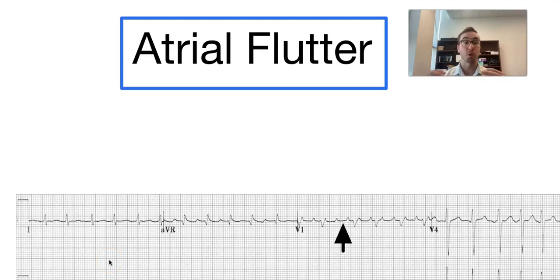So in this video, we're just going to briefly overview different supraventricular arrhythmias, because overall they have different key 12-lead ECG characteristics. In addition, this will help lead to your management priorities and treatments. And there's a couple of them that we look at.